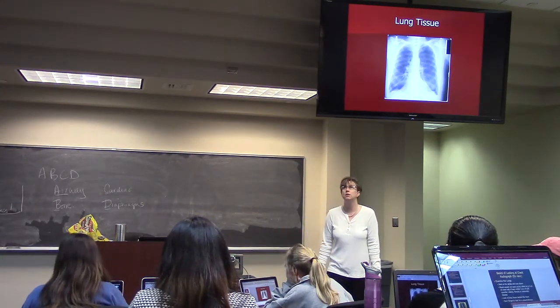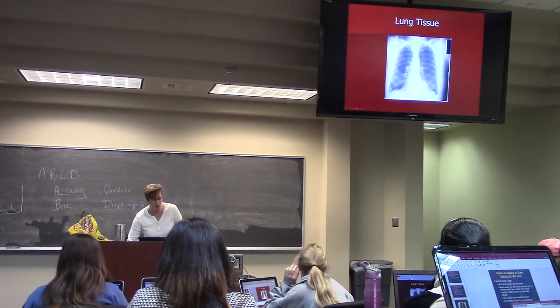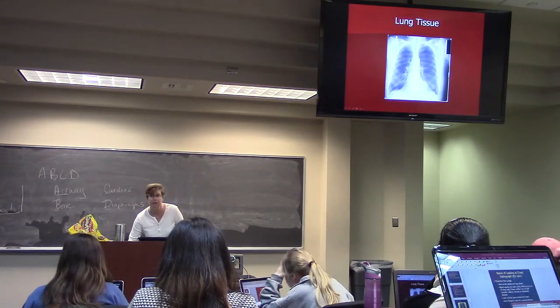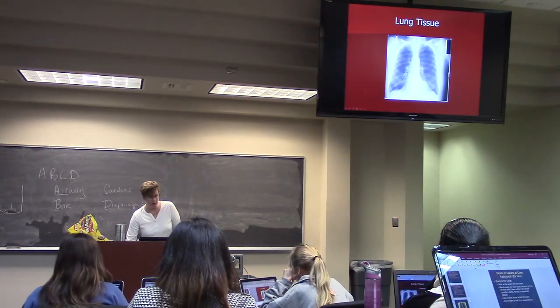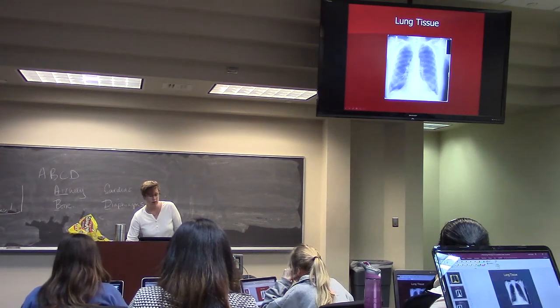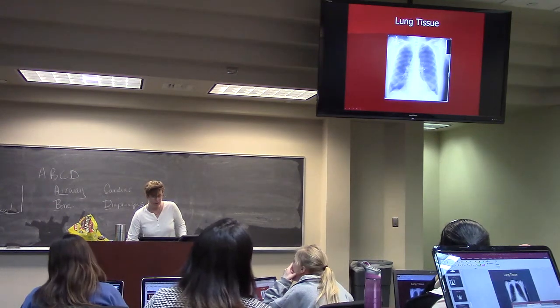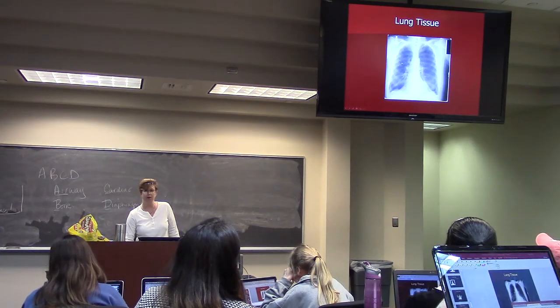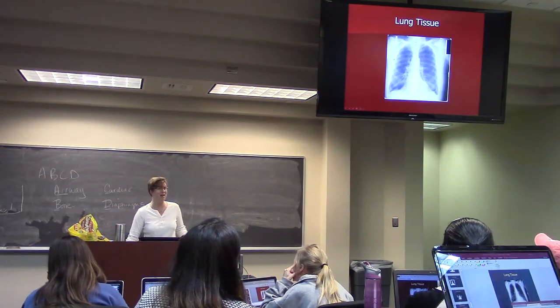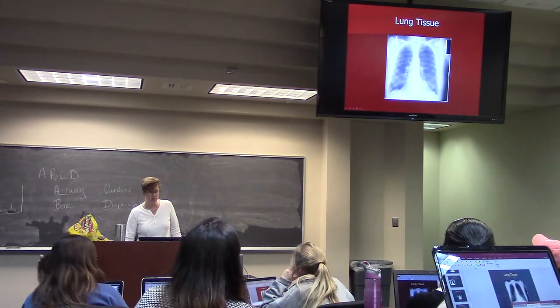So a little bit whiter versus darker here. You can see the vascular, this is the right hilar, comes out. A little bit lower versus the left. If you trace these out, they kind of disappear. You definitely see them here, but as they go up, they kind of disappear. They're not completely gone, but they're definitely not easy to track way out there. Don't really see anything out here.